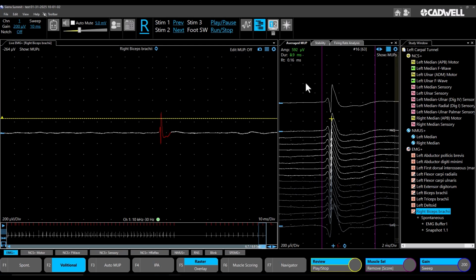Please take note that these results are based on the baseline activity and other factors, so you want to make sure you double check the cursors and don't just always go off what the numbers here show. If you have a noisy baseline, sometimes that can throw off the duration markers, and the amplitude markers are really just based on the quality of the data collected. You can click on any of these and change what results are visible. So you can see up to 3 results, and you can choose which results just by clicking on the result and picking something else.